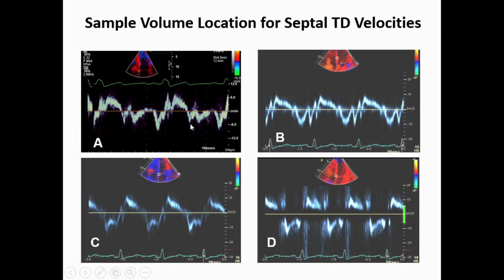Something that is maybe slightly less than 6 here, to something that is approaching 10, to something more than 10 and so on. None of these is a good signal. Notice where it is present. It is not at the septal side of the mitral annulus. It is almost in the distal area or region of the basal inferior septum.